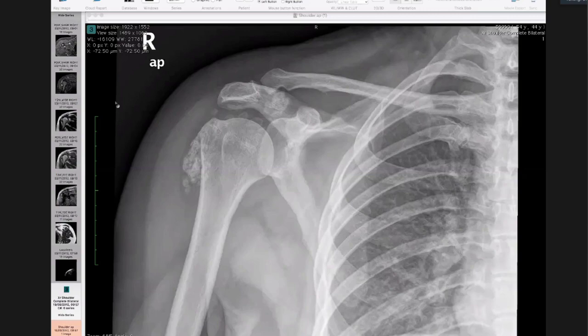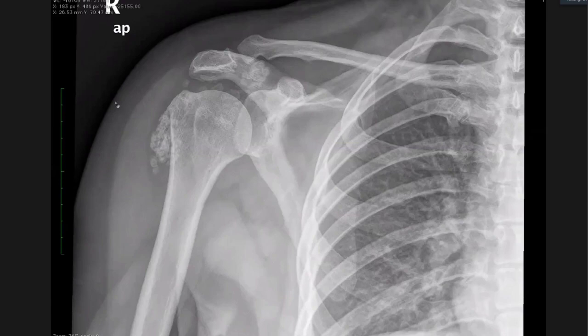So this is a frontal X-ray of the right shoulder of an adult female patient. I can see multiple rounded opacities of variable sizes, well corticated, around the humeral head and within the intracapsular region, probably. Also, they're projecting over the acromion and around the acromioclavicular joint.